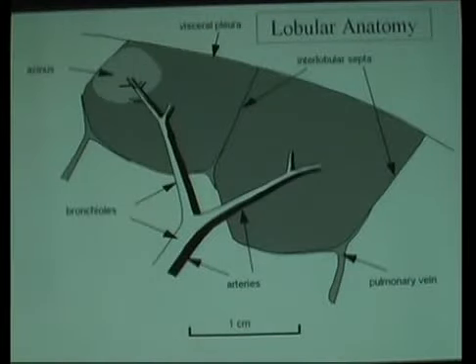So, real quick, let's just do lobular anatomy, because the key to this is going to be, in addition to looking along pleural surfaces and fissures, remembering the anatomy of the secondary lobule. Because it is truly the one advantage over chest radiographs that we have when we look in cross-section: we can actually define things in terms of the basic anatomic unit of the lung.